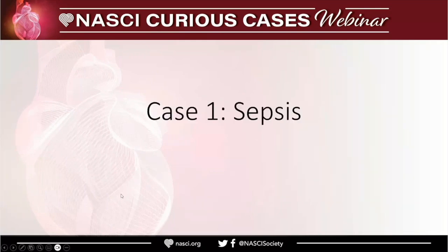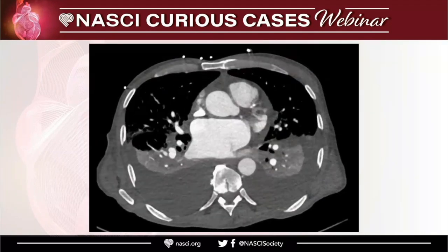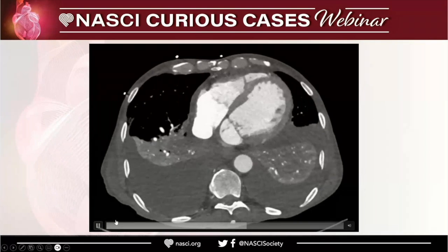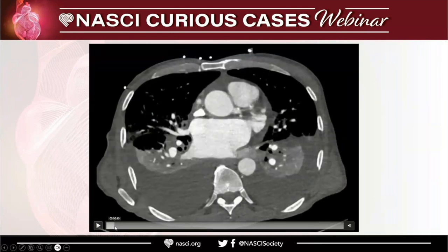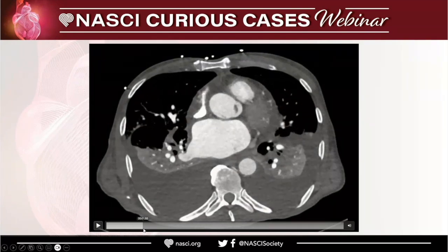So this is one case that I just signed this morning. This patient presented with sepsis, scanned last night. So I have the CT here, and I know I went pretty quick, so I will go back again. I feel like we are doing a similar theme. We didn't discuss our cases.